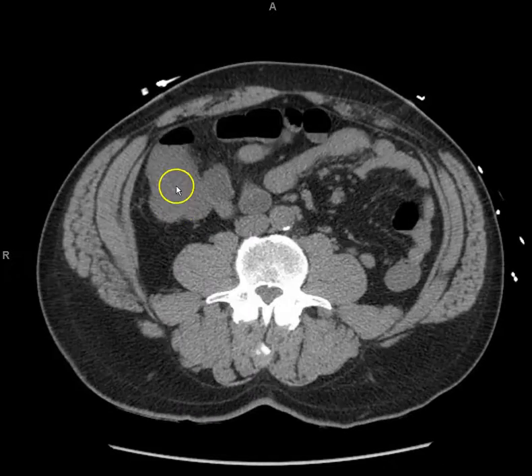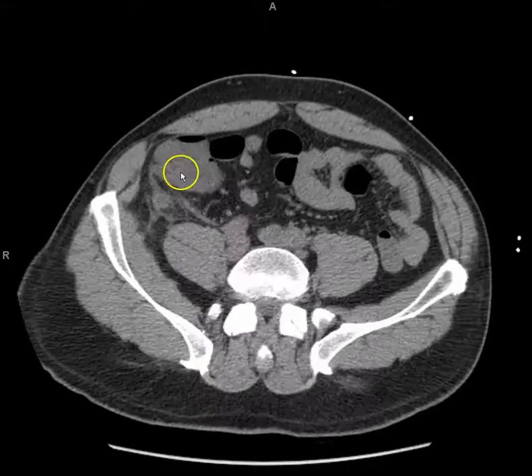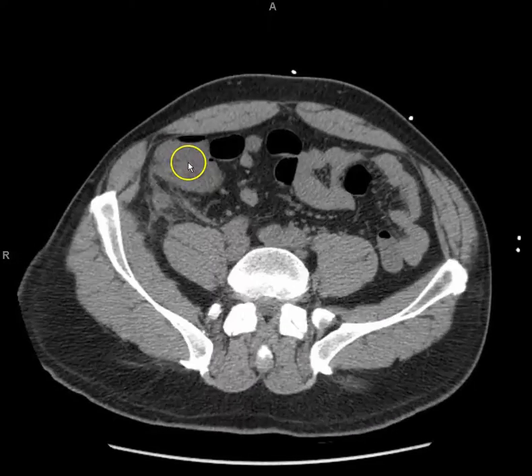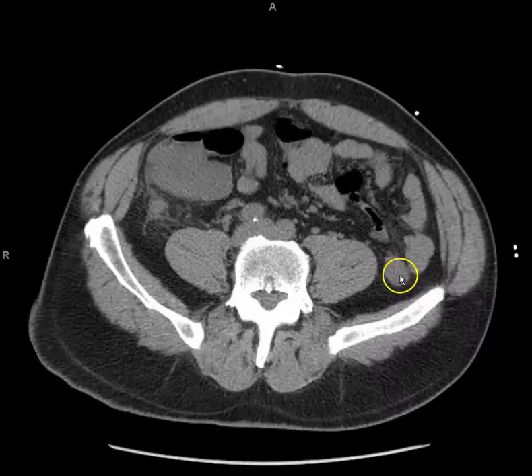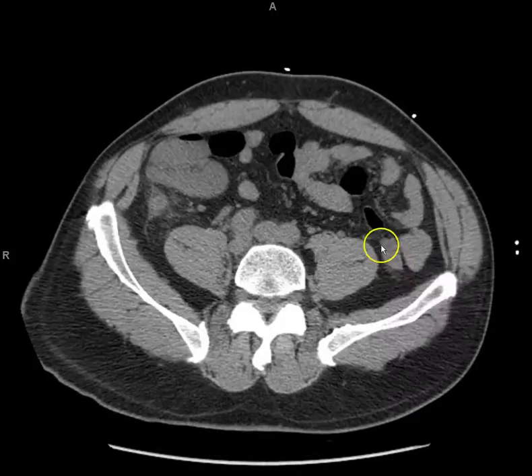And you come down. We're going to follow this down to where it ends. So it ends right there, huh? So what is this? Cecum. Good. This is small intestine. All of these are small intestine. This is probably sigmoid. Yes. Okay, so descending colon comes to form sigmoid.